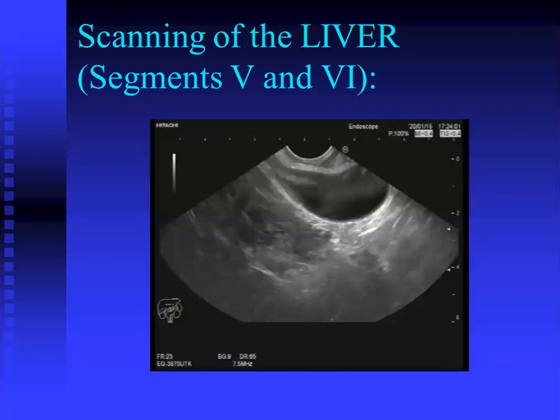To my mind, I examine it in every case, but it is especially important to examine in cases of staging of gastrointestinal, esophageal, gastric, or duodenal malignancy or pancreatic malignancy for possible liver metastasis, changing the management of the patient.